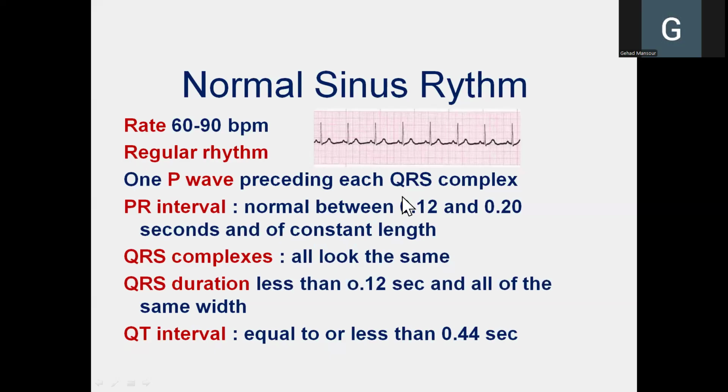Good morning. We stopped here in the last video, and in this video, I'll be focusing on the ECG strips that you might be encountering on the test and the valvular diseases. If I ever give you on the test a strip of ECG and ask you what this ECG strip represents, and justify your answer.